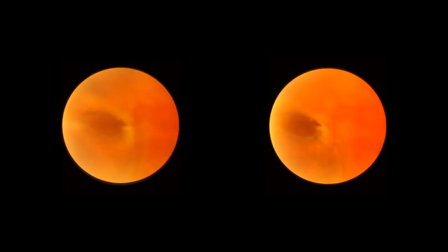This large reddish area in the nasal periphery of this left eye is actually an enclosed ora bay. For other examples of this, see slide pair 5 and 6. This developmental abnormality could easily be confused with a retinal break. A very unusual feature of this photograph is the presence of a tiny, true retinal break at the far right end of the enclosed ora bay, and lying just to the left of the yellow zone in the middle of the photograph.